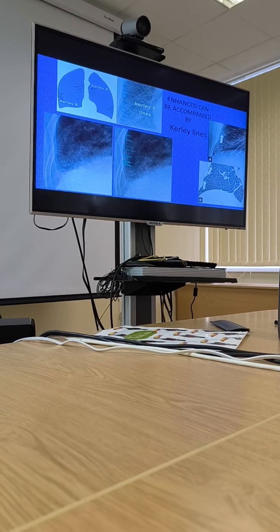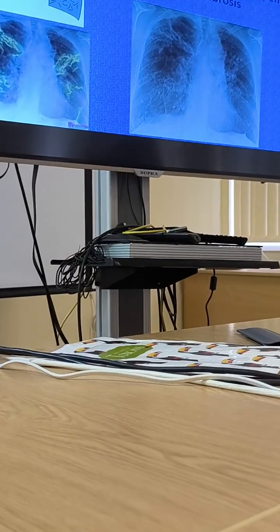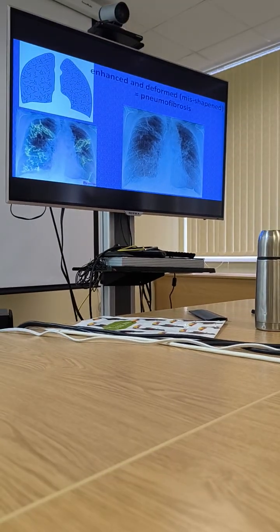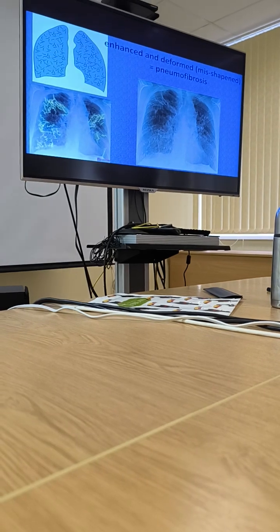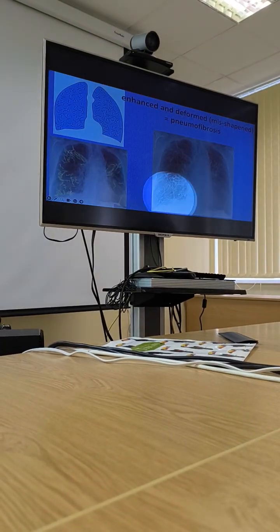So this is speaking about this deformed thing. That means that the basis of this deformation is fibrosis. So fibrotic tissue, which is growing in vessel walls, in bronchial walls, in the interstitium, like this, or you can see this there and there.